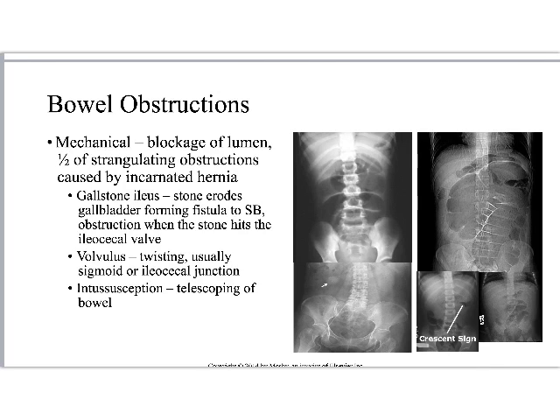And it's actually apparent on this image right here. You can see that giant gallstone. Sorry, you can't see my arrow. This giant gallstone right here, right? That's a gallstone. Ain't no gallbladder right there. That's the terminal ileum, right?